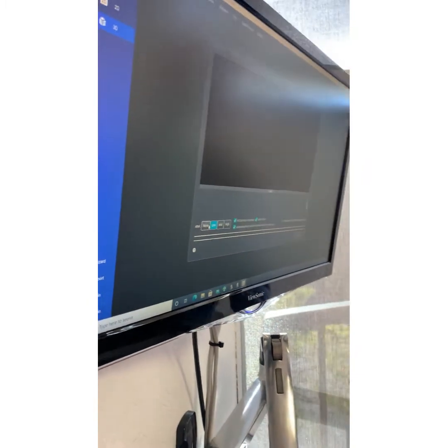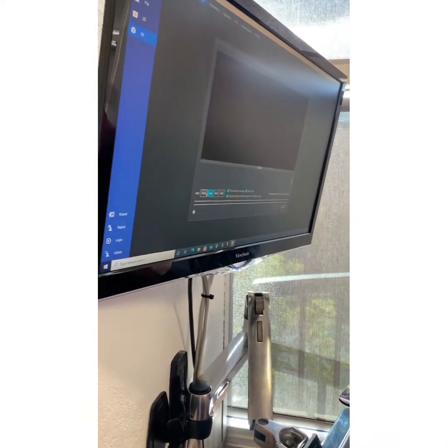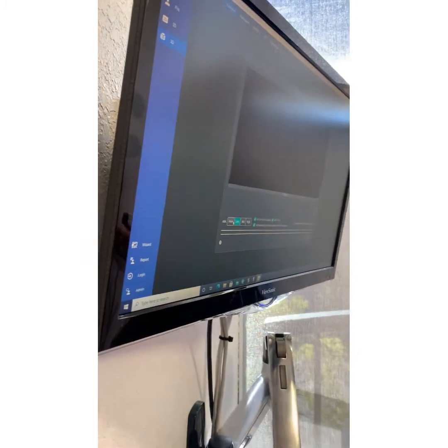So scatter. Most of us as adults have enough restorative material to warrant either mid or high. Amalgams create scatter, gold crowns, existing implants, all that stuff. Somebody comes in with braces. What about just a composite? No, it has to be metal.